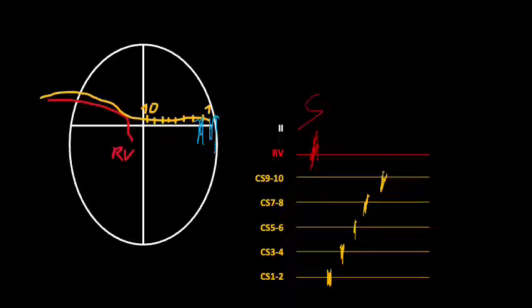The problem is when we've got the patient with the accessory pathway located close to the septum, close to the bundle of His, because in this case, we've got the concentric activation of the atrium. Of course, we should check the conduction, is there a decrement or not, but this can be also a little bit misleading, so that's why in this case we should perform the para-Hisian pacing.